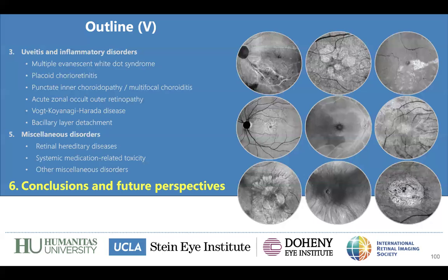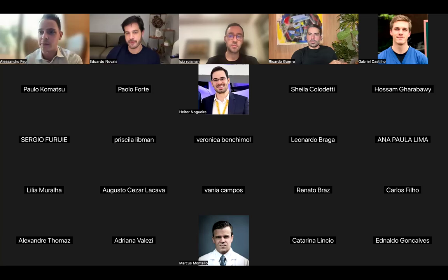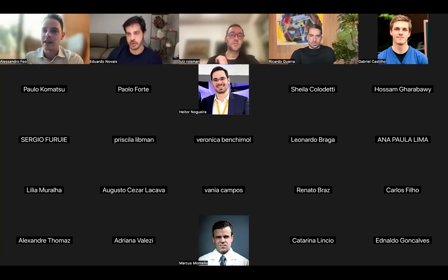Also, more practically, what I see in clinic is the use of heat maps to detect non-exudative or exudative choroidal or macular neovascularization. If you use the heat map on an outer retinal segmentation, you can extremely easily and quickly visualize the areas that are more elevated, which are, of course, red in these heat maps.